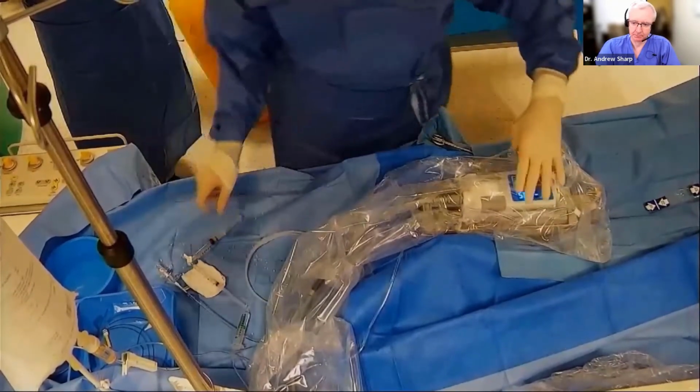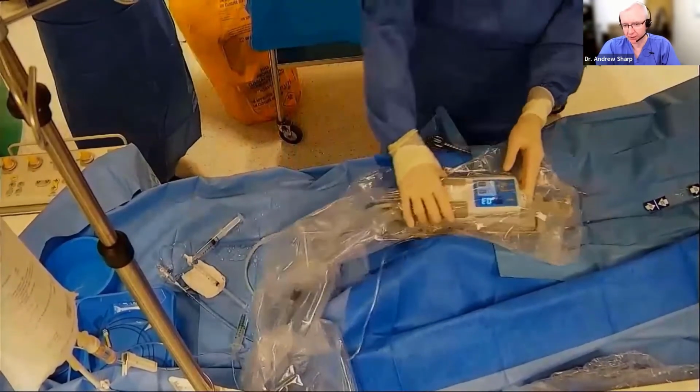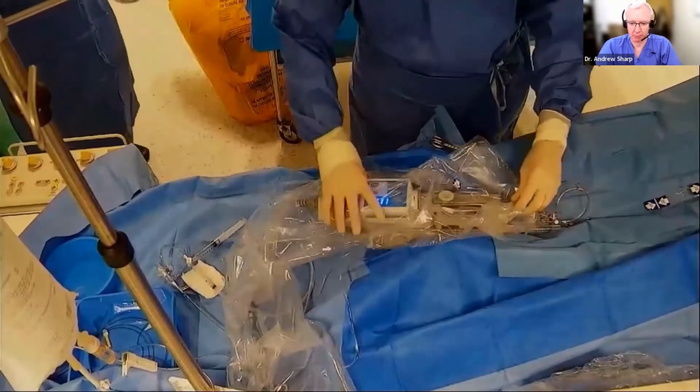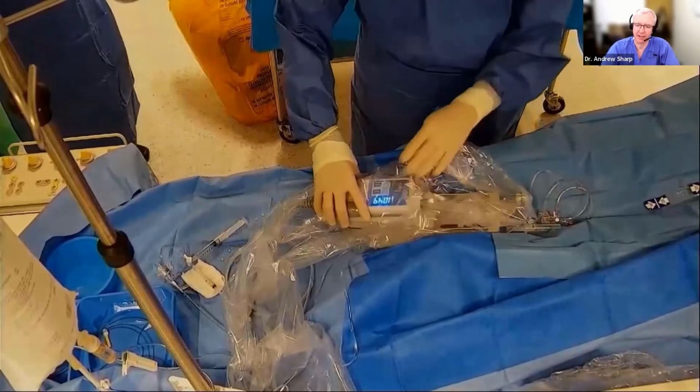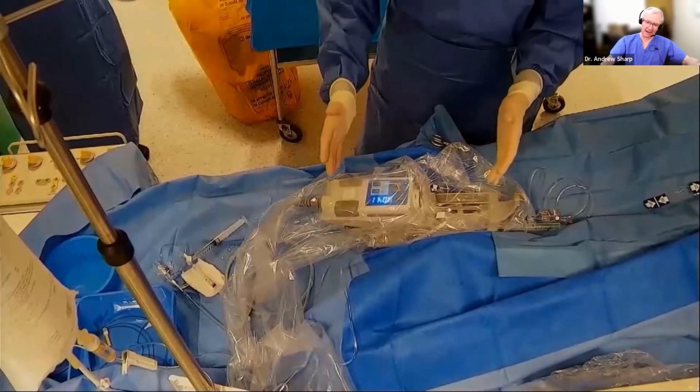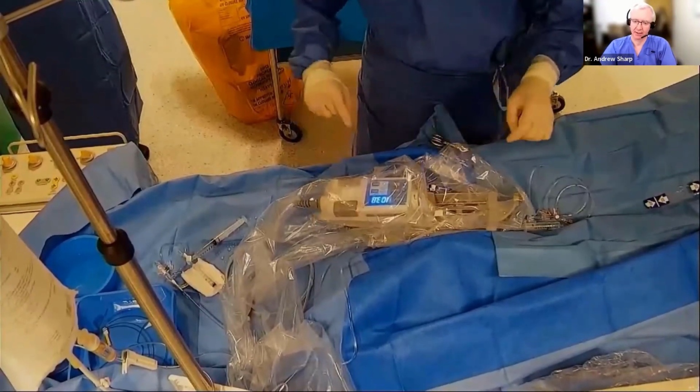We then connect up, but before I do that, I'm going to show you how we handle the sled. So you click onto manual and you bring the sled back. Now, one really important thing is you have enough slack in the plastic bag that the hub can go all the way back.